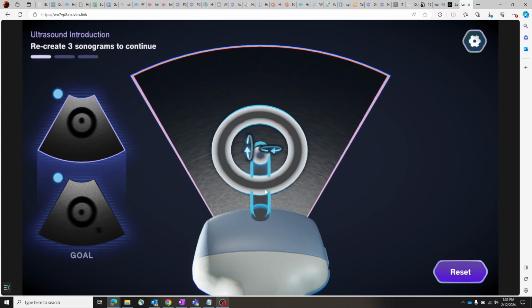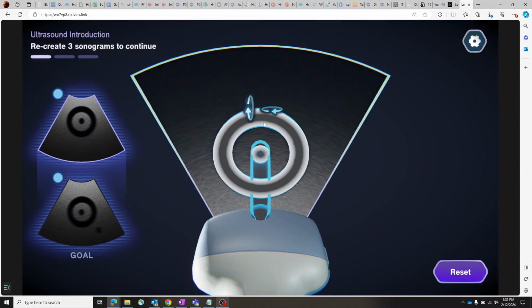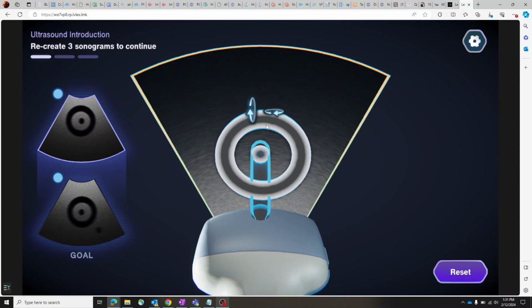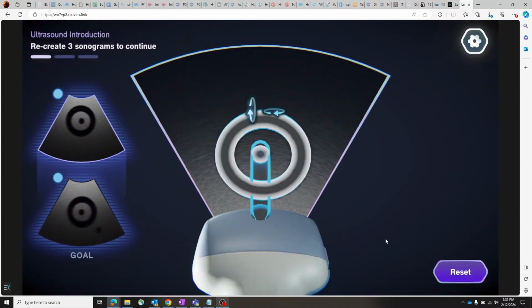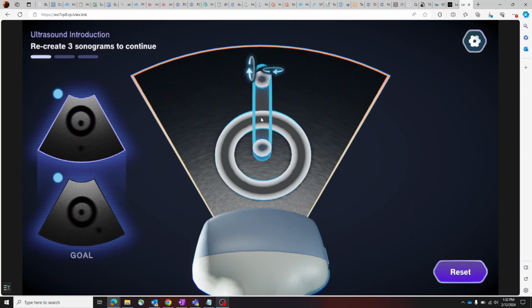So here we're getting more into that dynamic aspect of the ultrasound scanning. So now you're able to look at multiple viewpoints and try and figure out key features of these different shapes that allow you to identify which one is inside. We tried to keep it to some easy to identify objects that you find commonly.